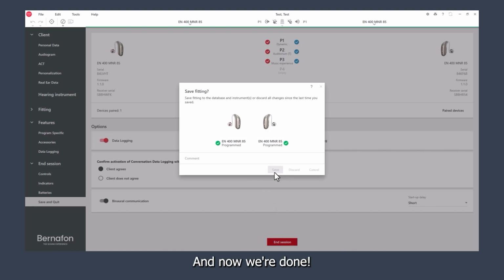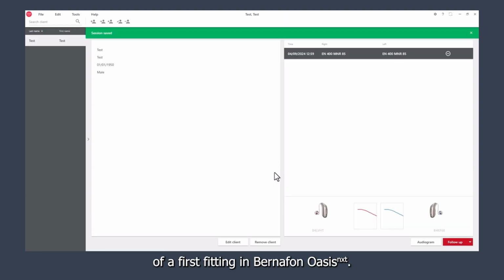And now we're done. In this video, we walked through the process of a first fitting in Bernafon Oasisnxt. Oasisnxt is an intuitive fitting software that makes it easy to customize your client's hearing aid fittings.